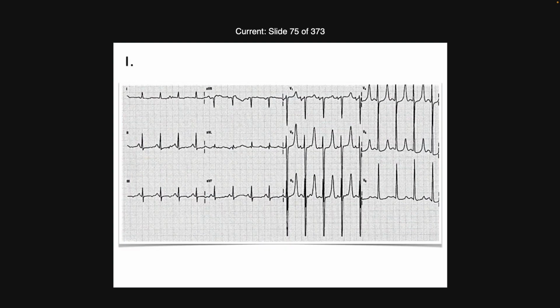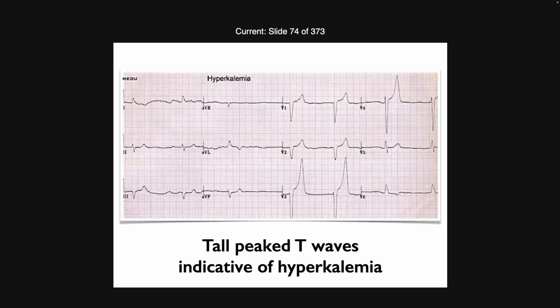So here's another one. Oh, no, that's number 1. So 1, 2, and 3, it'll take you about 30 seconds. Look at 1, 2, and 3, say hyperkalemia or hyperacute. Again, it's going to be super easy.